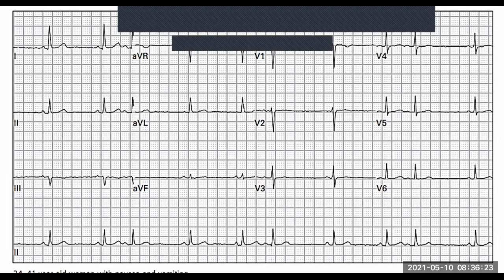So in other words, the atrium is malfunctioning. But whenever it does malfunction, it is still sending its signal through to the ventricle. So that means the ventricle is following the atrium. It's not that there's a hard block between them. So this means the problem is lying where? In the atrium or in the ventricle? In the atrium, very good. So that means there's something going wrong with this atrium, all right?